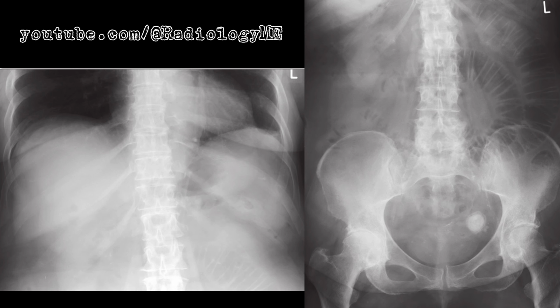So, where did this gallstone come from? It likely passed through a fistula that formed between the gallbladder and the small bowel due to chronic inflammation or infection, allowing the stone to travel down and lodge itself, causing obstruction. At this point, I'm leaning heavily towards a diagnosis of gallstone ileus, a condition where a large gallstone obstructs the bowel, but let's be thorough.